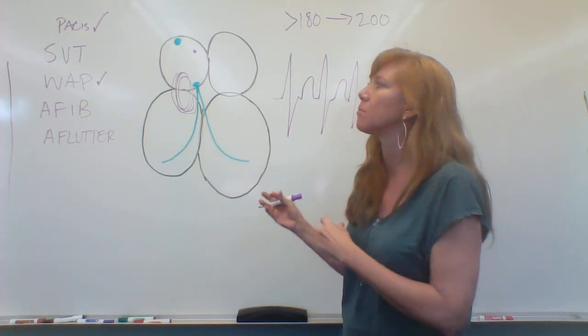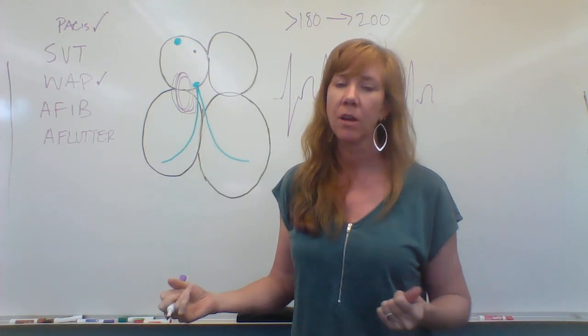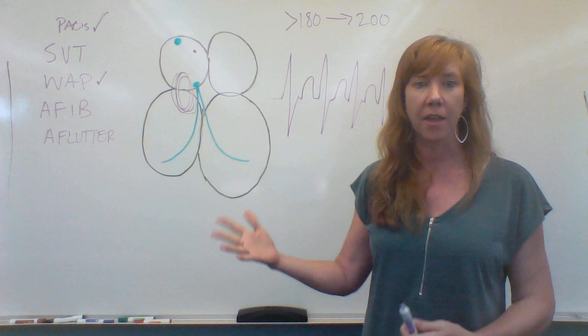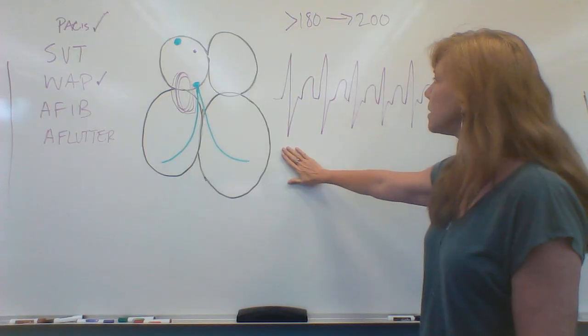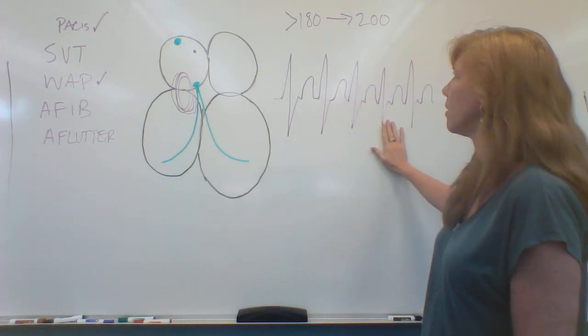But as a starting place for 90% of the hospital and just like first response of where you want to work, here are the things you need to know about SVT. You hear the alarm go ding, ding, ding, and you look up and you see something that's skinny QRS, one lump, skinny QRS, one lump, skinny QRS, one lump.